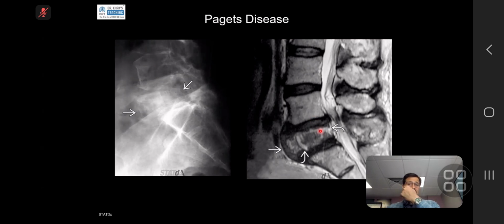So as I was telling you, a Paget's vertebra is not a healthy vertebra, so it can collapse. But the key thing they will show you in the exam, the key thing will be size. And why has it collapsed? What do you think? There is no history of trauma. And the answer is that actually this was inherent Paget's disease.